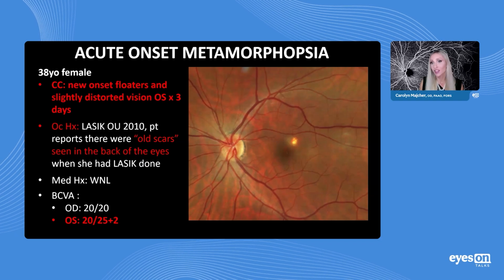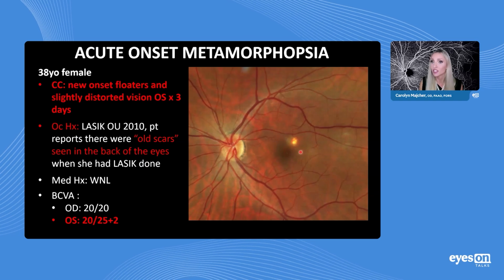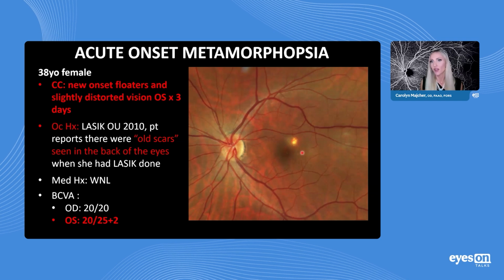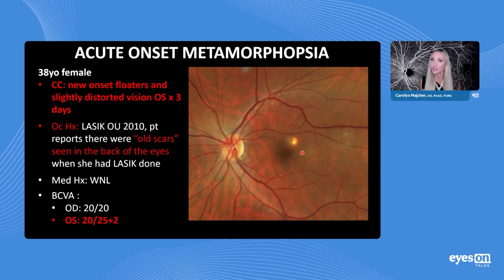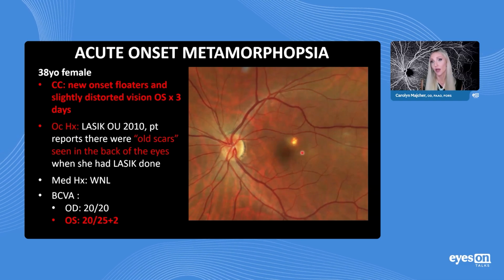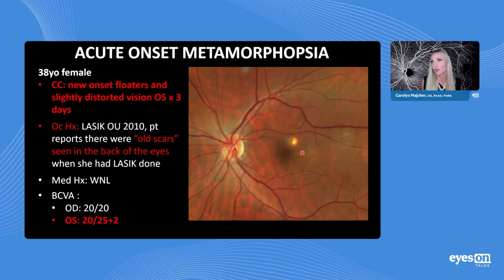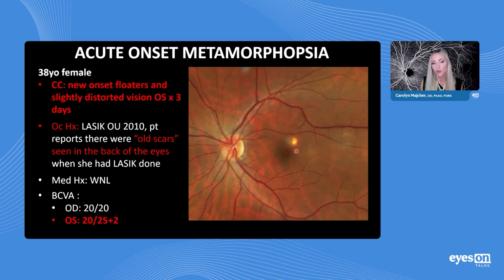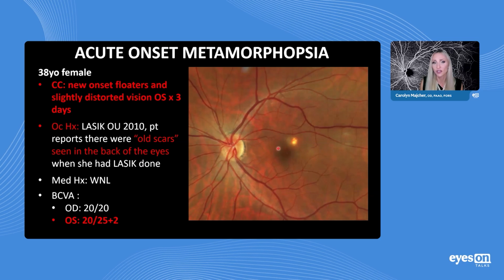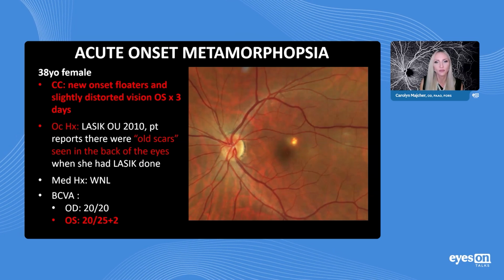As we can see in the macular color photography here, she has a round hypopigmented lesion in the superior temporal aspect of the macula. What's important to note is that the margins of this round lesion are kind of fuzzy. If this was just an area of RPE dropout, or a window defect, we would expect the margins to be far more distinct, like with geographic atrophy. Whereas here, the borders are fuzzy, especially on the more nasal aspect of this lesion. It almost has this opacity, kind of a grayish, greenish hue to it.